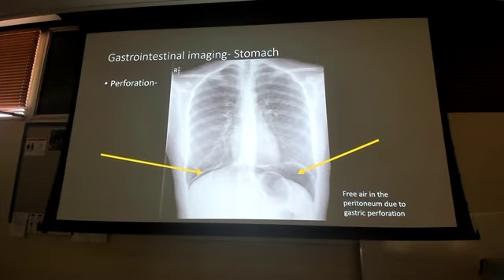And when we're concerned about ulcers, we get concerned about perforation, and usually this is the first time you're going to see it. So this is just kind of bringing it all back, right? Those ulcers perforate, we cause a pneumoperitoneum. Pneumoperitoneum makes you go, okay, what perforated and what's going on? Okay, in this case, this particular patient, it was a stomach ulcer that perforated, causing air in the abdomen.